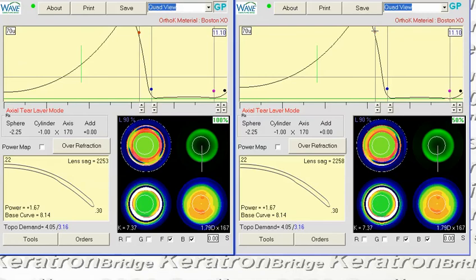So I'll just start with the lower meridian here. By the way, we're at 1.67. If we want 3/4 more, that would put us at, what would that be? 3.42 or so. I'm sorry, that would be 2.42. So that would be our target.